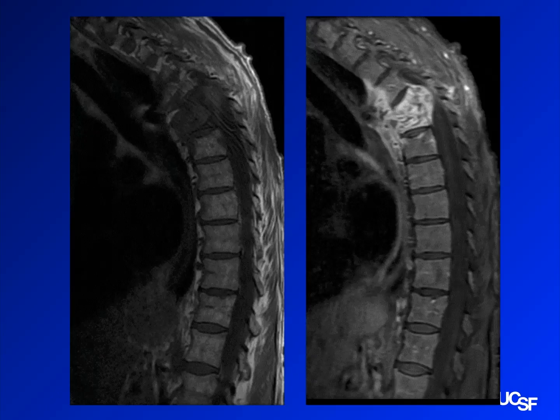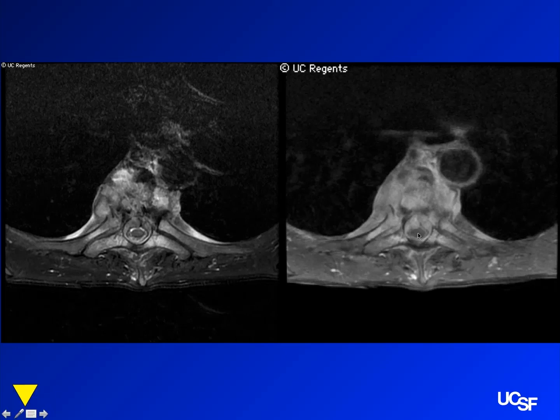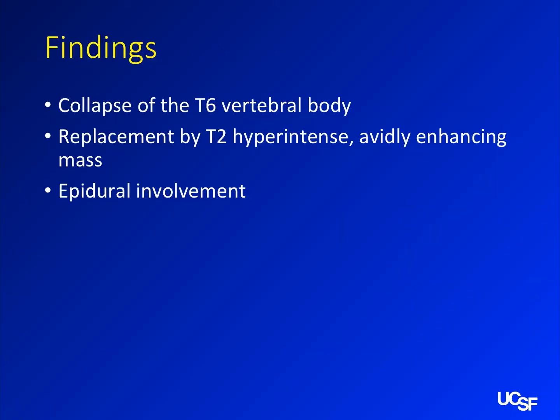Perfect. Yeah, so there's an enhancing mass there. There's destruction of that disc space. You have horrible encroachment into the spinal canal. You've got prevertebral soft tissue swelling. I like it. Step up to the plate, knock it out of the park. That's discitis osteomyelitis.